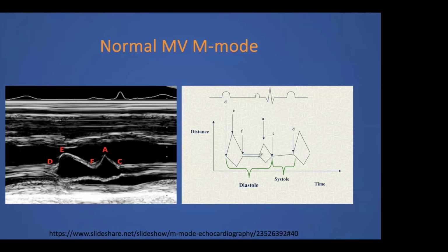For example, if the patient develops atrial fibrillation, there will not be a contraction. If the patient develops atrial flutter, you will have multiple A's. If there is thickening, you will not see this thin, nice, crisp line. Every disease has its own finding. If something happens during systole, if something happens during diastole, what if there are masses, like vegetation or whatever?